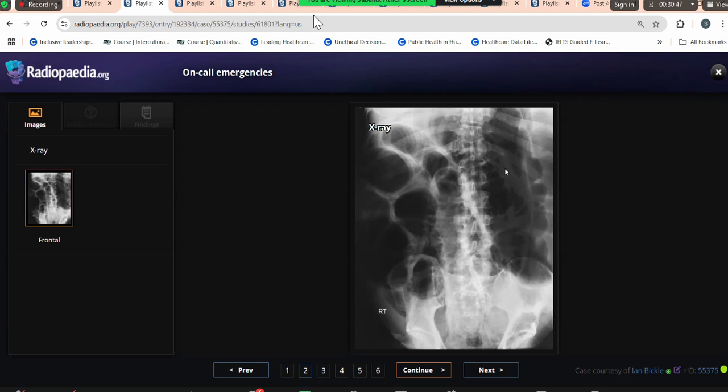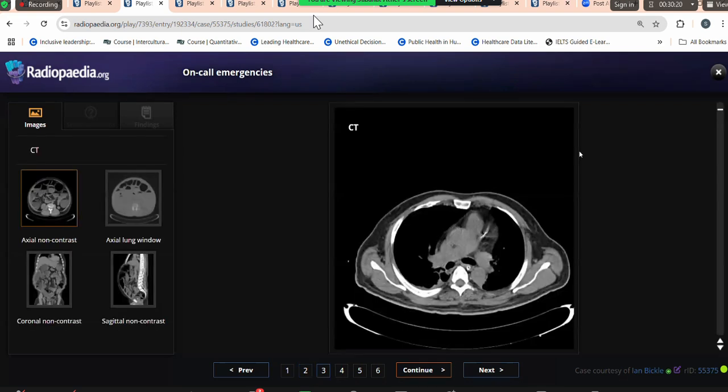Okay. Is there anything else you would like to see other than the radiograph? If there's a CT of the patient available. Okay, leave the mouse. I'll give you the CT. Candidate 4, can you see the CT abdomen here? Yes, ma'am. Okay, go ahead.